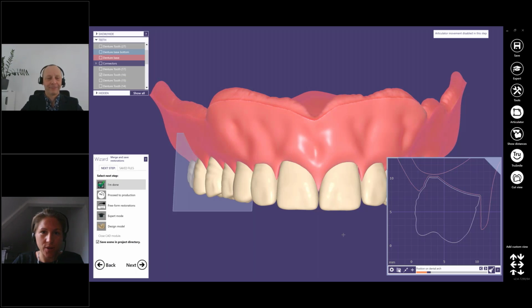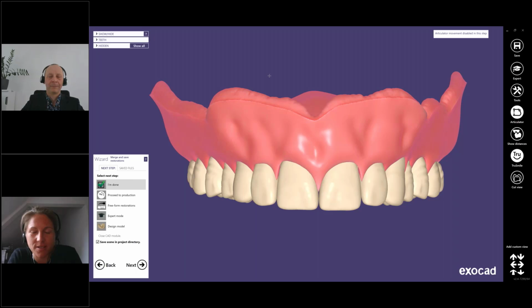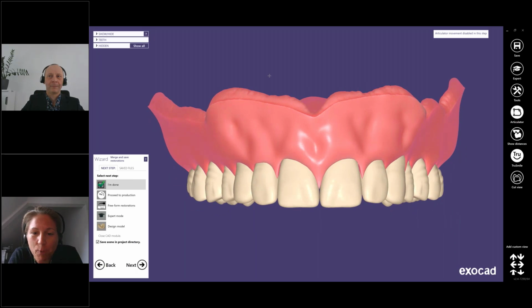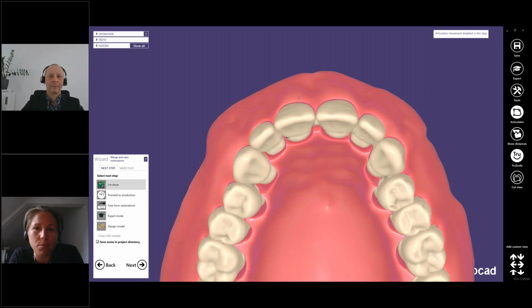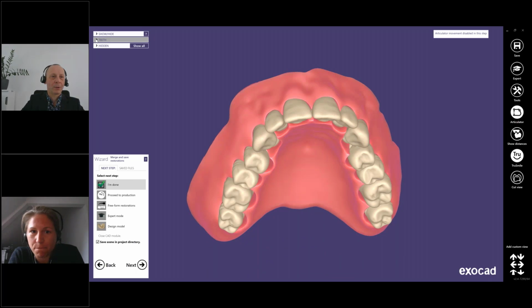Okay. There was one good question also. Maybe it's better to explain it one more time because you have two options. Why is the palatinal side of the gingiva so open when you generate a monoblock? One second, monoblock.